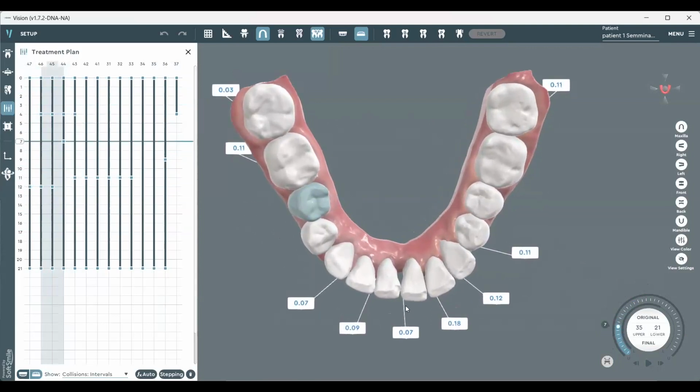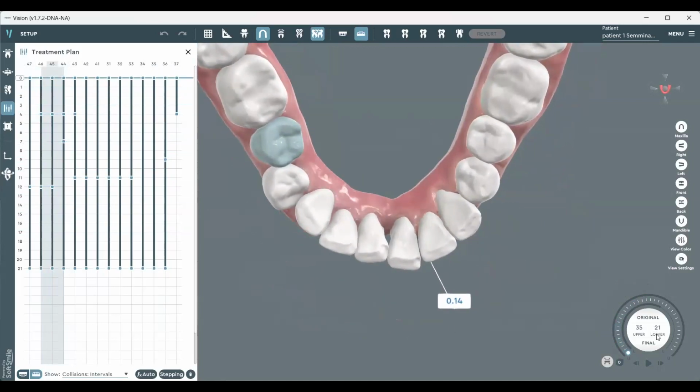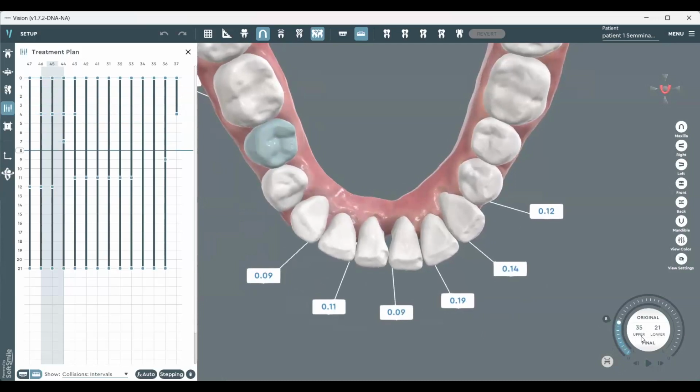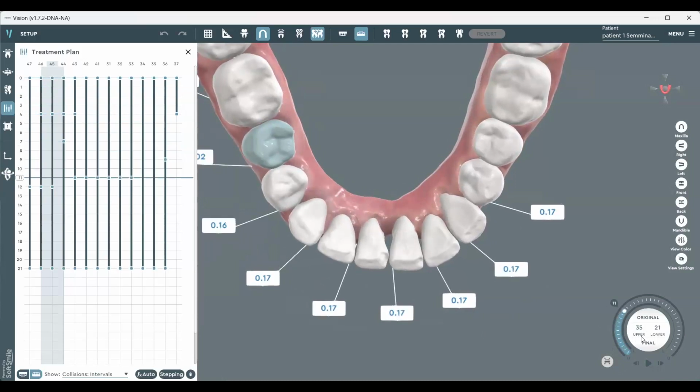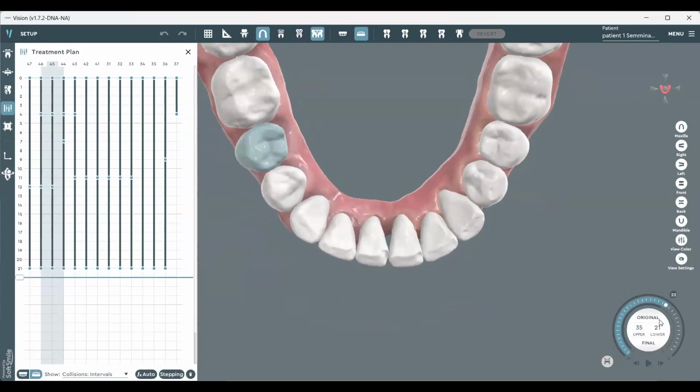And another thing that I want to show you on the lower arch is something that we call zero tolerance for crowding cases. This is going to be also shown in the next treatment plan, that is a crowding case. But I also did it here because I have crowding in these areas. And to resolve the crowding, I did a zero tolerance protocol for anteriors. So I open the spaces, very careful. And then when I have a better alignment of the teeth, I retract and close the spaces.